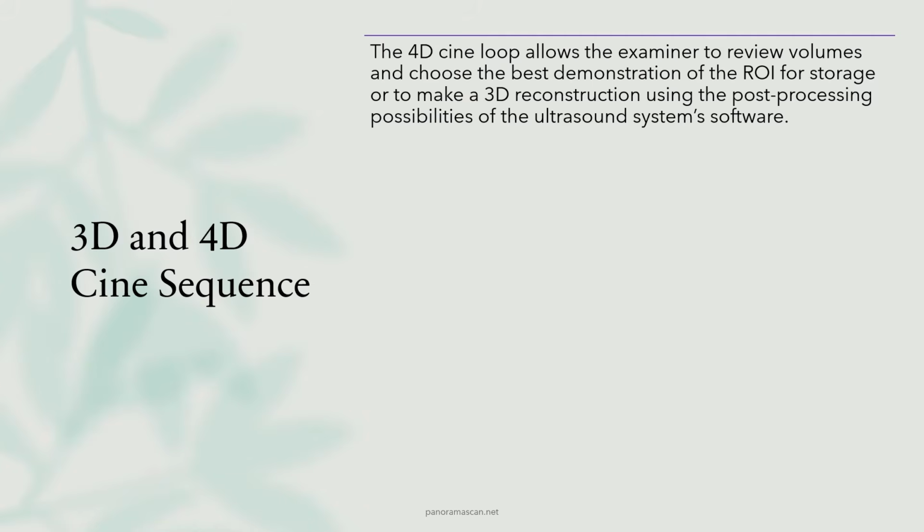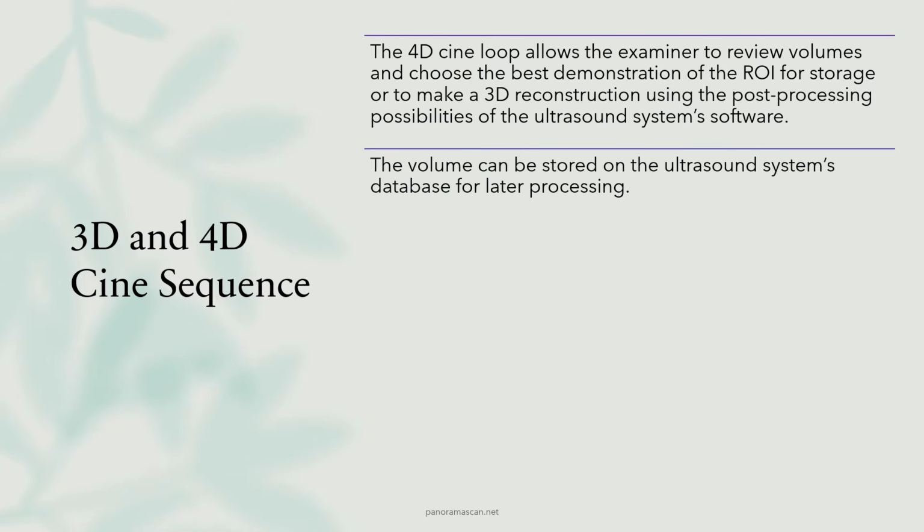After capturing the volume, it can be stored in the ultrasound system's database for later processing. This enables additional adjustments such as reorientation, rendering, and other enhancements to create an accurate 3D or 4D reconstruction, enhancing the diagnostic value of the image.